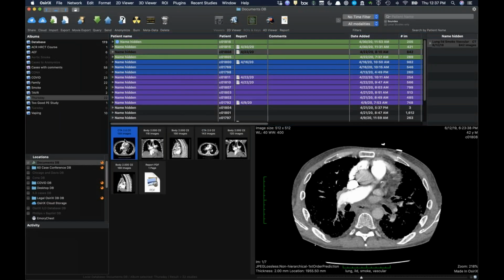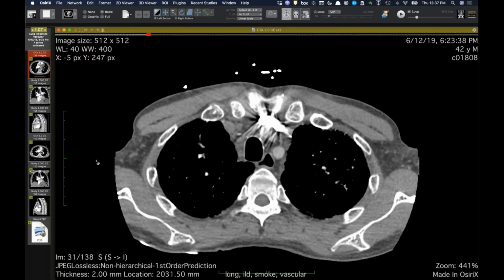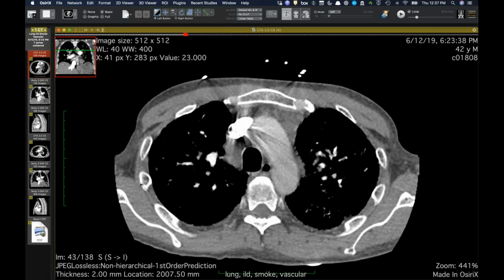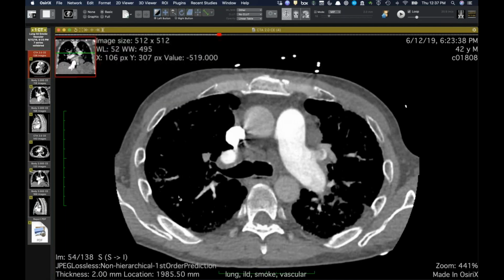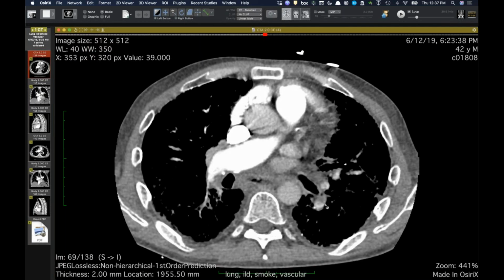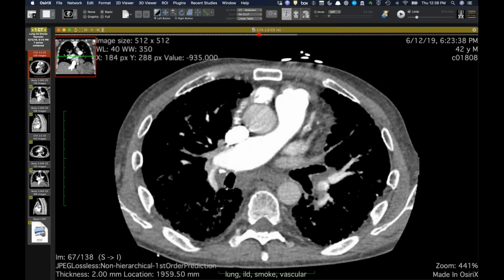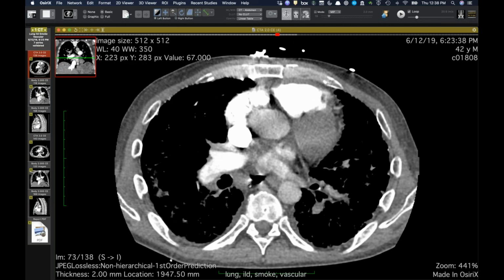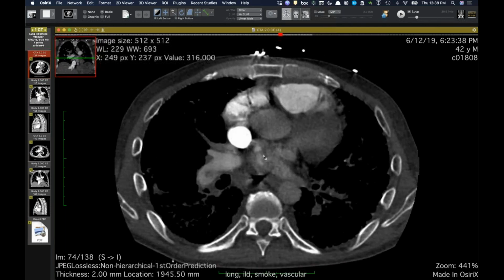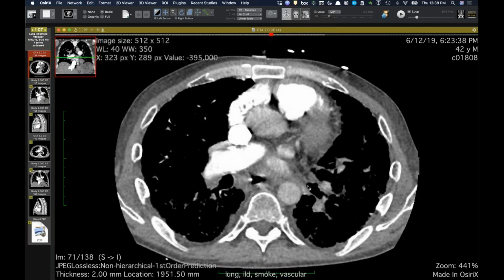Completely unplanned. All right, this one hits a few good diagnoses, and we'll start. This is a 42-year-old who had 2 PE studies done at outside hospitals a few weeks apart, both called positive for pulmonary embolism, neither of which I believe. There do appear to be filling defects in the pulmonary arteries. However, on the left side we have some contrast making it across a patent foramen ovale, but we really don't have much in the pulmonary veins, especially in the lower lobes.